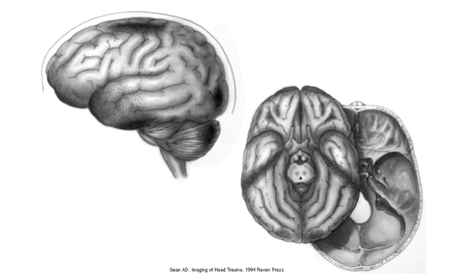These are examples of where in the brain one typically sees cortical contusions: the anterior aspects of the temporal lobes, the inferior frontal lobe, the convexity, and the posterior aspects of the occipital lobe and the cerebellum. And that's due to the fact that the brain hits against these roughened surfaces of the skull base and calvarium there.